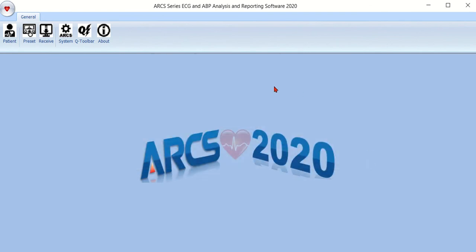Okay, this concludes this section of the video education on ARCS 2020. In the next section, we'll review the patient directory, which will then take us directly into the Holter analysis steps.